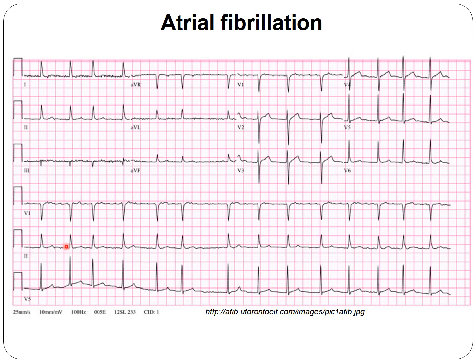Atrial fibrillation, arrhythmia absoluta, and there is no P wave. A P wave has to be round, symmetric, similar P waves. If you look at V1, you can see this P wave looks like a P wave, but when you look at the rate, it is more than 300, so that's fibrillatory waves. So this is atrial fibrillation, and the QRS is narrow.